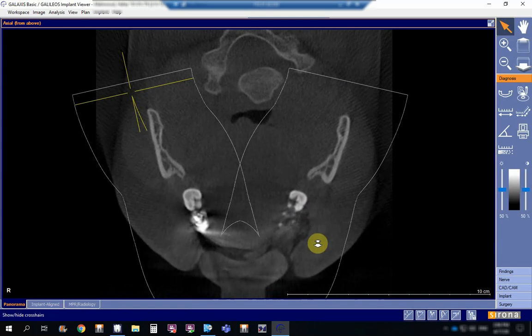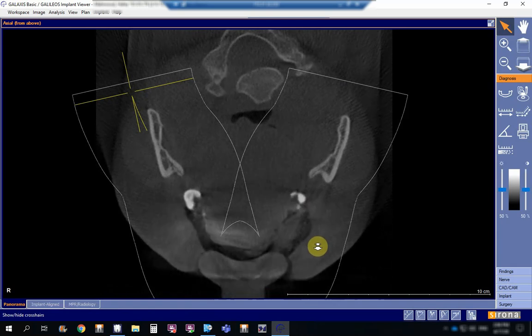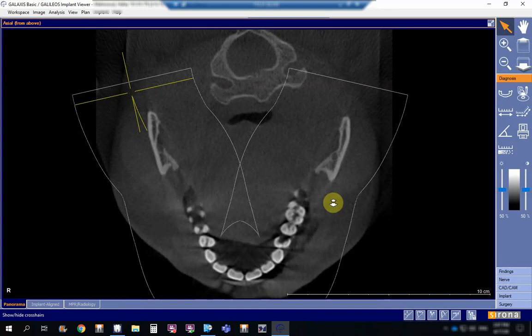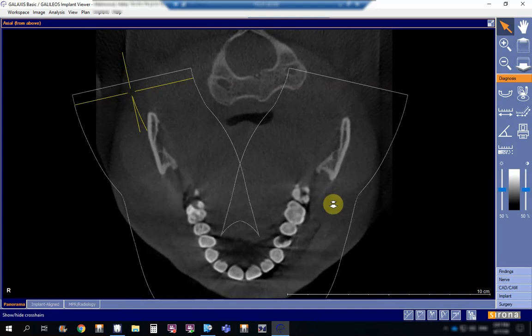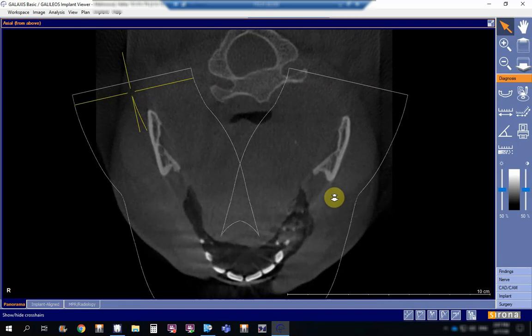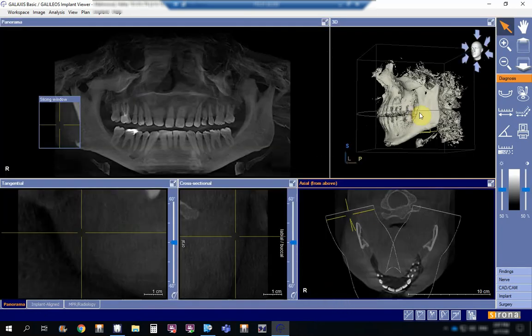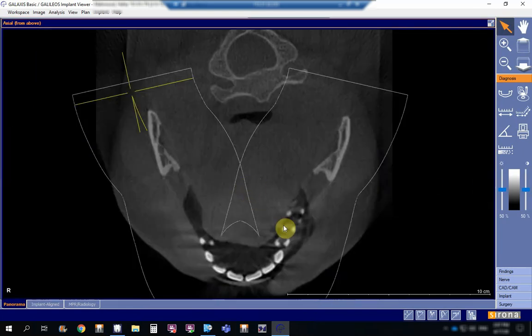We're going up now. We are beyond the level of the teeth. Now we're starting to have here the mandibular foramen on either side, which is the start of the inferior alveolar canal. Now after this level, I'll take you back so that you will get oriented. See here, we're starting to go into the level of the maxillary teeth, and this is the central, lateral, canine, 4, 5. I will go up.